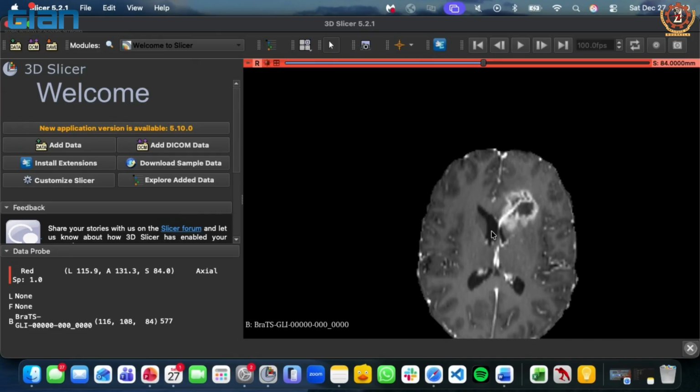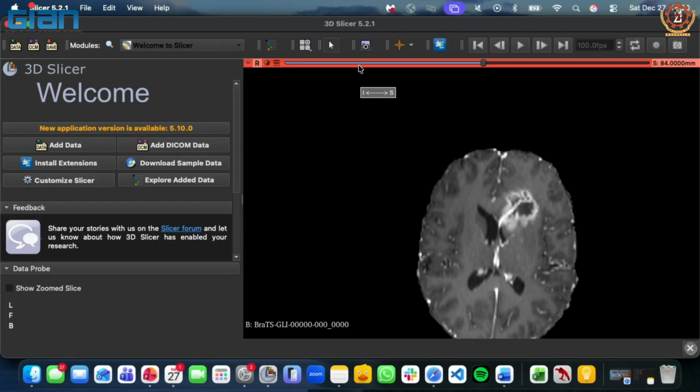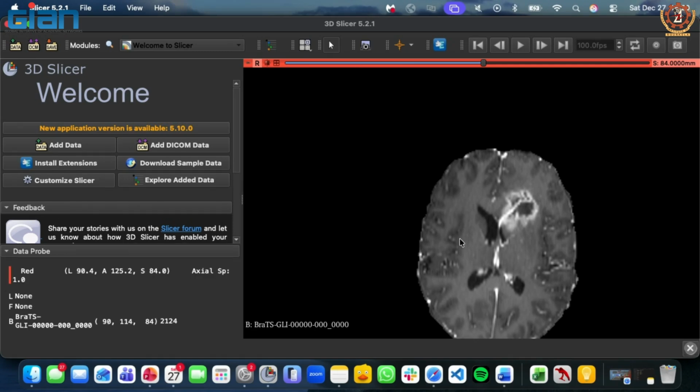If you want to segment these intricate anatomies of the brain, you know that human brains are of course very different, but the anatomies are kind of the same. The cortical gray matter will be on the side, then there will be white matter, and then there will be lateral ventricles. You can try to use some edge detection filters to detect the edges of these anatomies and segment them. If you don't want to use deep learning, there have been methods which used edge detection for anatomy segmentation. That's why I wanted to first visualize it and then come back to that segmentation discussion which someone just pointed out.